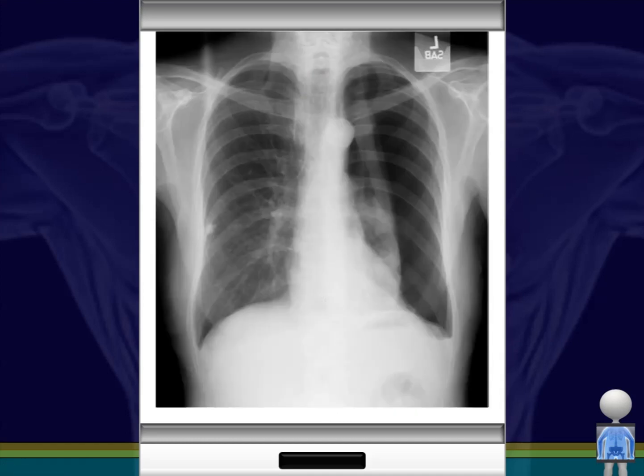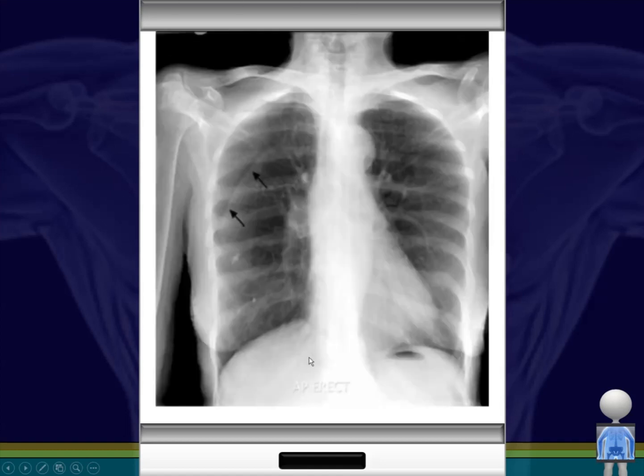So let's look at this pneumothorax on the other side of the chest. So again, in this case, the right lung looks normal. This all looks normal, and here we see a very large pneumothorax with the black, the dark, and you can see the outside line of the collapsed lung. This is a smaller pneumothorax. So here we see normal pulmonary markings on both sides, but we see a little bit darker here, and you see the very faint line of a small pneumothorax.